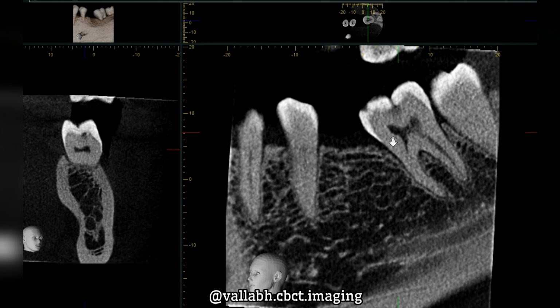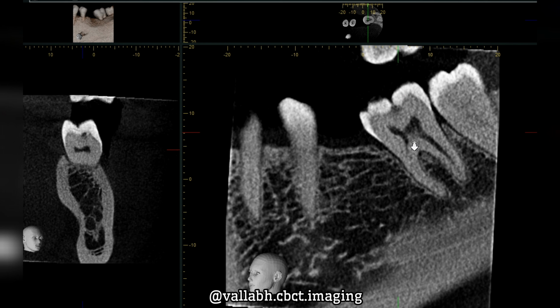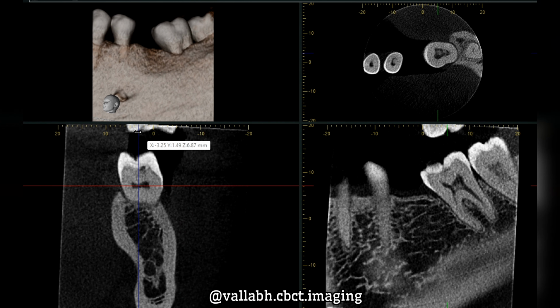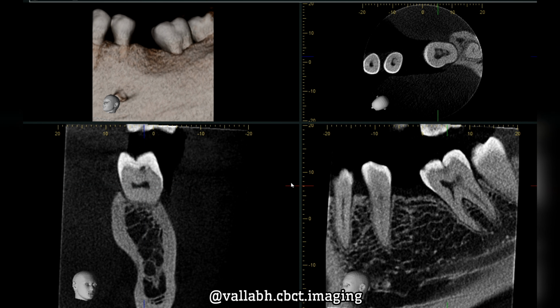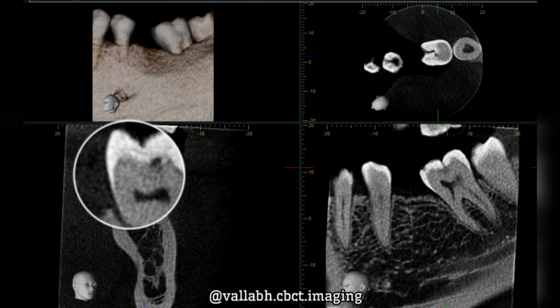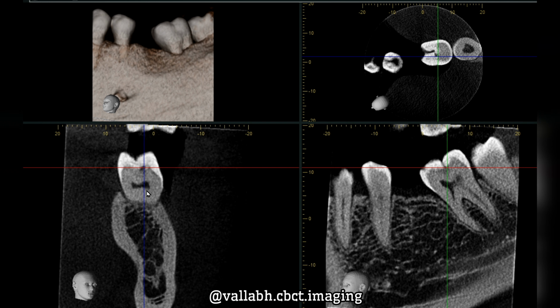Okay, so basically in this case, this is the radiolucent caries that is seen approaching the enamel, dentino-enamel junction and involving the dentine. It has not approached the pulp. The same thing can be seen in other cross sections also. This is the coronal radiolucency as seen. It has involved the dentine. We always have to cross check with other cross sections as well.